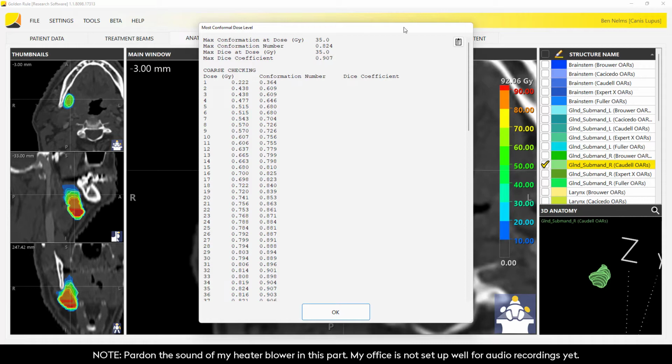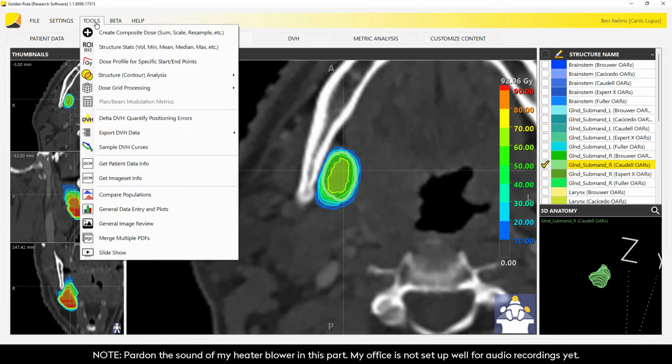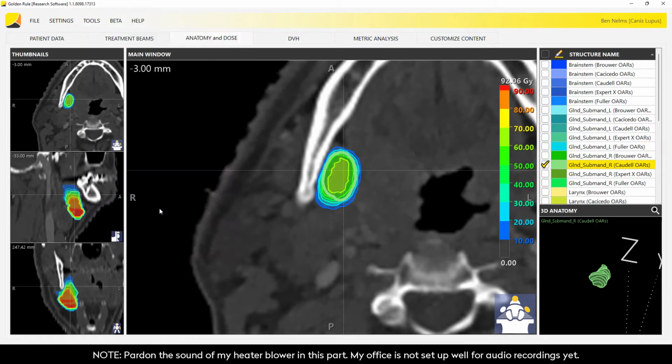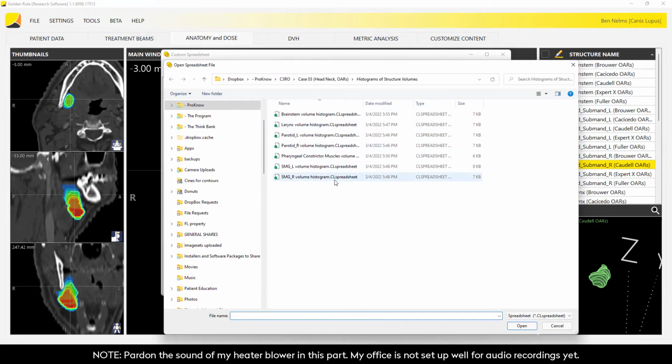So that's a pretty large region of overlap there. And again, at the 35% level, pretty similar to the agreement level where Jimmy was matching on the parotid. So that's kind of maybe interesting. Let's see if that happens on the left as well. But before we move on, let's look at just the volume, the size that people thought here.